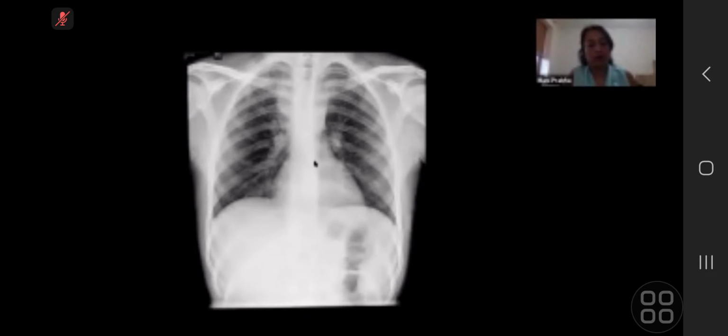In this one, the cardiac shadow is all right. There is slight prominence of bilateral hilum. Also, paratracheal thickening is there, and widening of superior mediastinum. Not much is seen in the lungs on the left side, but there is some streaky opacification in the right apex, which raises the possibility that there is a parenchymal lung lesion. And we would like to do a CT scan.